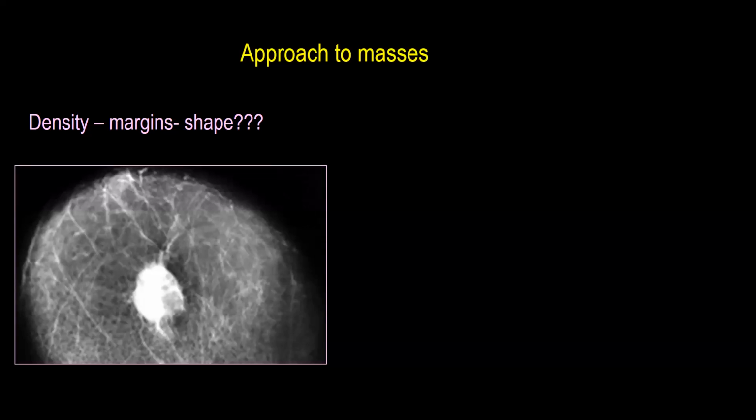Not necessarily an artifact. You see, it can be necrosis. The density is not always homogeneous, but we have to be logical. It is a spiculated mass, and it is patchy here and here and here. So I am not going to consider it a mixed density.